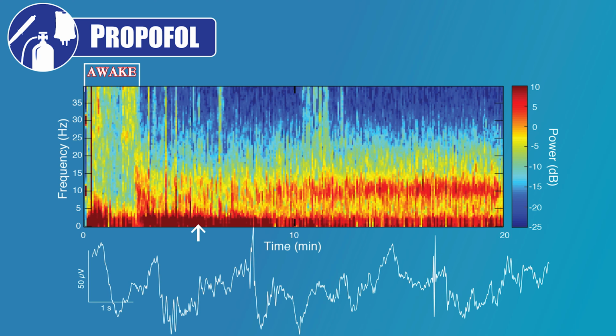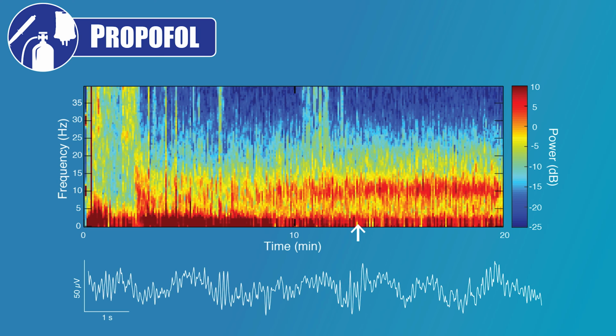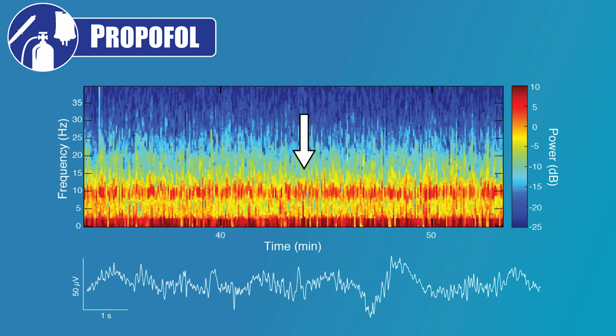and atonia. As the initial, profound effects of the bolus dose of propofol recede, the EEG then evolves into a slow delta and alpha oscillation pattern. The transition time from the slow delta pattern to the combined slow delta with alpha pattern depends on how profound the bolus dose effect was. During maintenance, we observe our typical propofol pattern.